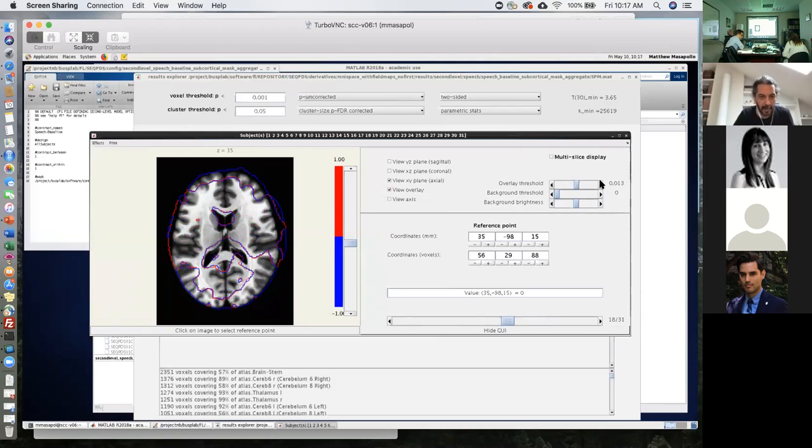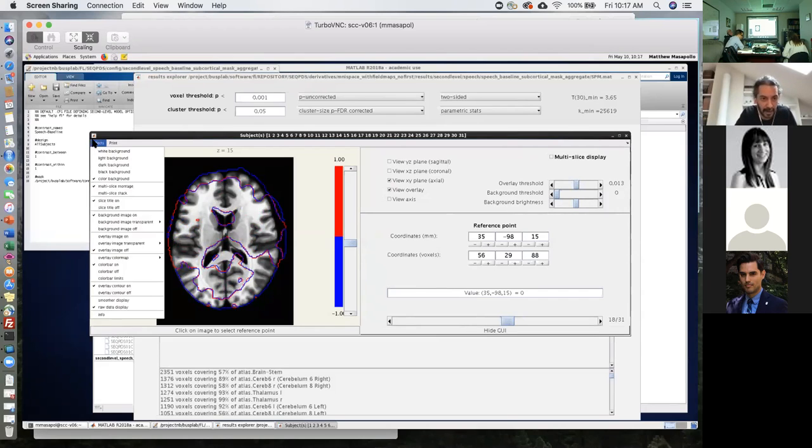To be in the actual mask, the border of the regions that have zero values, not numbers, those are the ones that are outside of the brain, and the regions that are within those masks are the regions that are within the brain. And if I look at the actual values, it should look like, let's see.